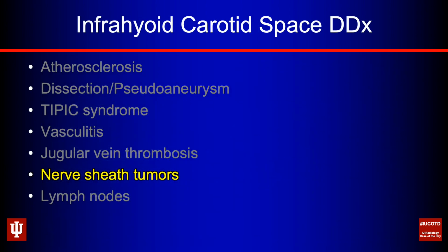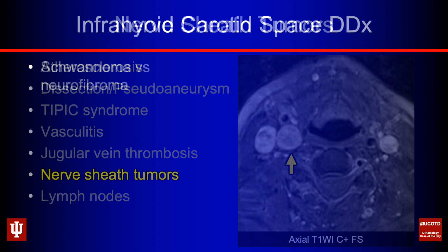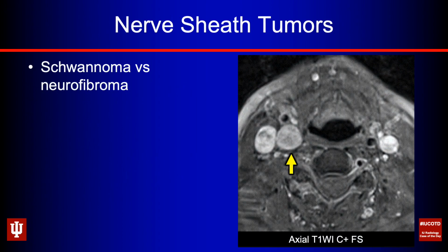All right, next we'll talk about nerve sheath tumor. These are going to be schwannomas or neurofibromas. I suppose I could throw in malignant peripheral nerve sheath tumor as well. But with the benign nerve sheath tumors, we're dealing with circumscribed and fusiform masses. They can look quite similar. Sometimes neurofibromas are lower density on CT, and more commonly have a true target sign to them because they grow sort of throughout the nerve. They grow centrally within the nerve rather than schwannomas that grow eccentric to the nerve.